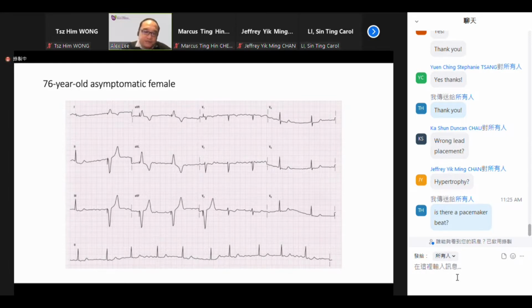What is it then? If it's not very organized, it's a fibrillation wave. All right, these are AFib waves, undulating. So the term is undulating baseline on the ECG. Undulating means wavy, but is not very organized. It's not sawtooth. Sawtooth is very organized, like a triangular sawtooth shape.